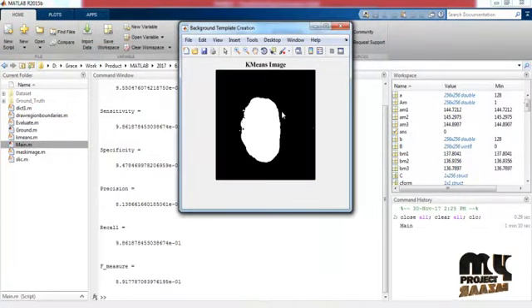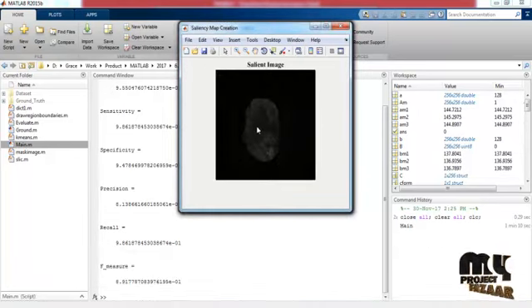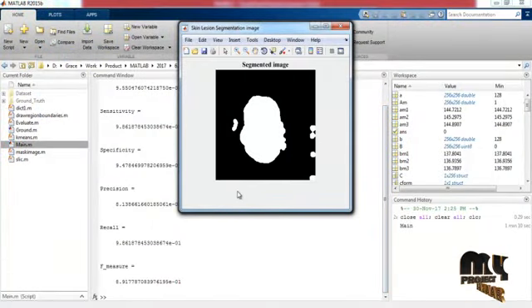This figure represents the K-means segmentation algorithm. The white region indicates the affected part and the black region indicates the non-affected part. The affected part region is displayed in comparison with the SLIC image, and then the saliency map image is computed here, and the saliency image is compared to segment the particular affected region in the image.